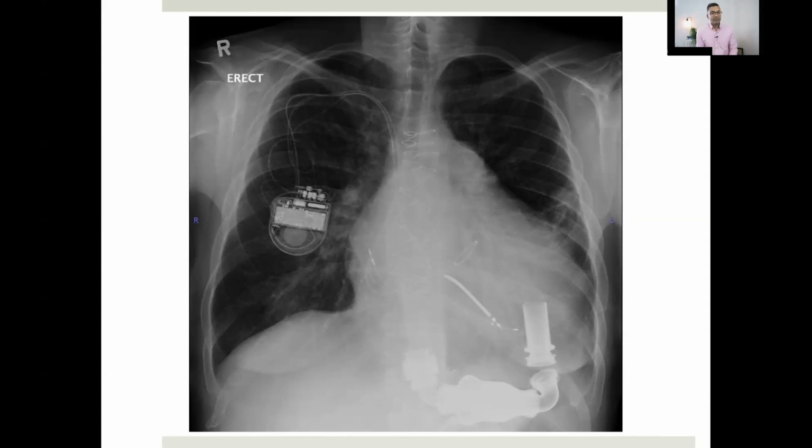So the most striking things that I can see here is that there's a patient that's had a previous sternotomy with sternotomy wires in situ. They have had a valve replacement by the looks of it. And looking at the positioning, I may be wrong here, but I think that might be a mitral valve replacement, or certainly an annuloplasty.